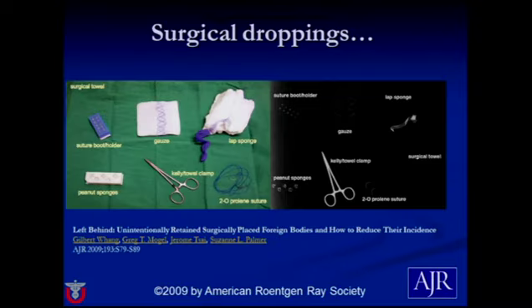Moving on to more chronic pain, you always have to remember in people who've had an operative delivery that there may be some sutures or swabs or even surgical implements remaining. We have come a long way in trying to avoid that, and everyone does their timeouts and their instrument count and sponge counts. But this is a nice article that shows you the appearances of the pieces of stuff that are as they are on the tray in the operating room, and then what they look like on X-ray.